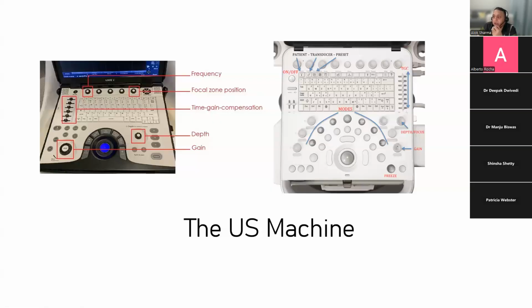Always wait for the machine to boot, and machines should always be booted plugged in. If your machine is not plugged in, you're in big trouble because you might have a battery that's 10%. And really, can I just warn you that when you press the on button and the machine crashes because it has no battery, there's a real risk that your motherboard will actually short circuit. So please, always when you're using the machine, don't leave it on battery.